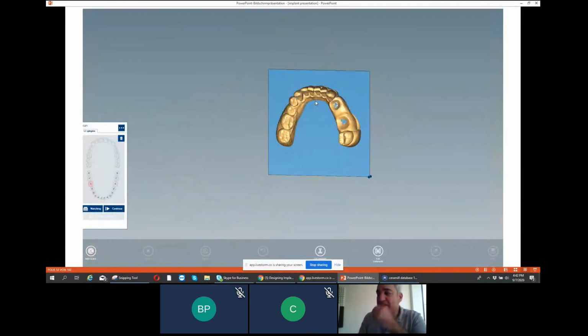But in some scanners in the market, it could be our scanner or a different scanner that can get to STL file. When we scan the gingiva and you need to move on to start construction, you see that the gingiva is not in the right position 100%. That's why.